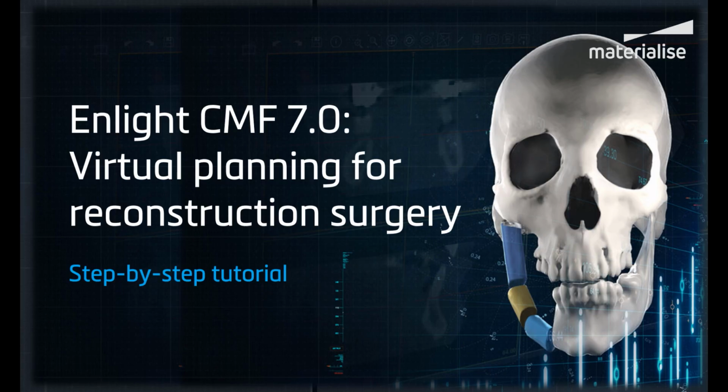In this tutorial, I will show you how to plan a mandible reconstruction using Mimics Enlight CMF. We will start with just the CT images and go over all the steps needed to plan the case in 3D. The first step in 3D planning is making the 3D models that we are going to work with. And there are two options to do so.